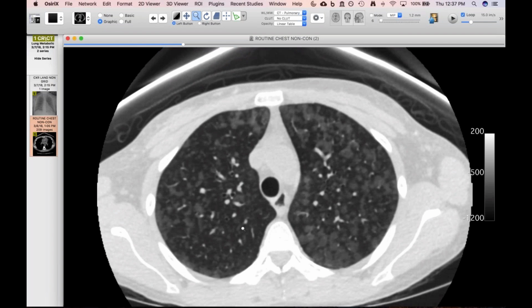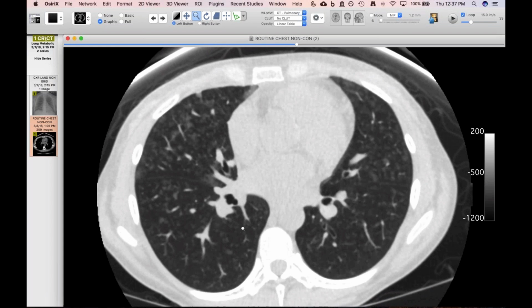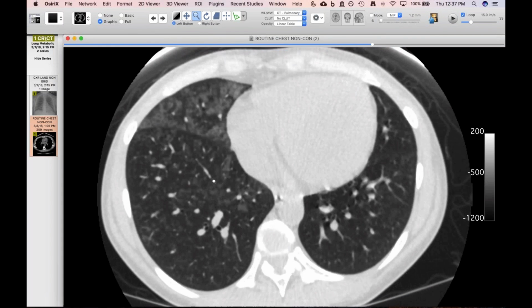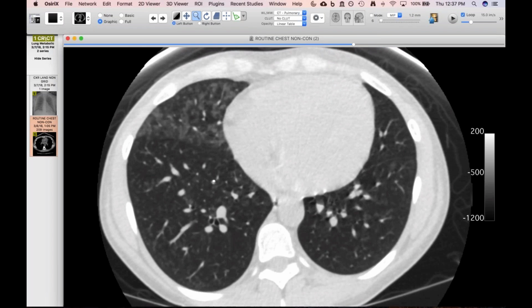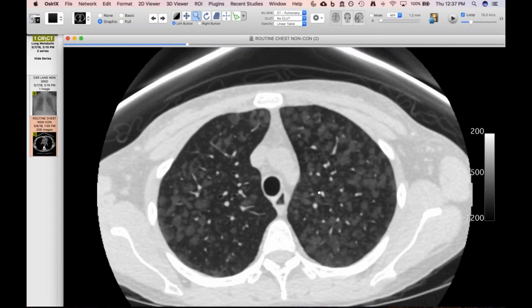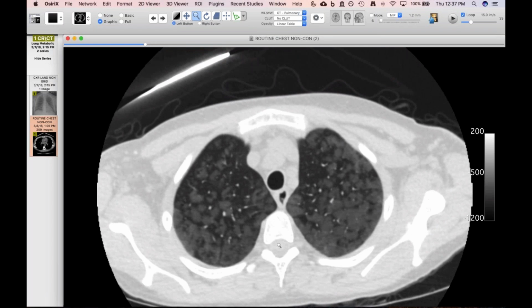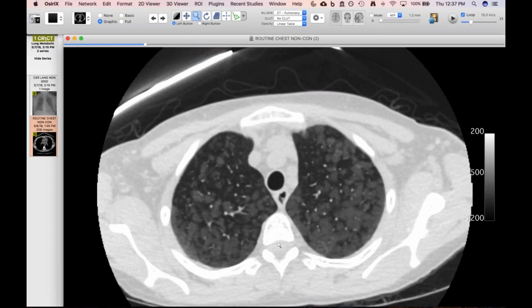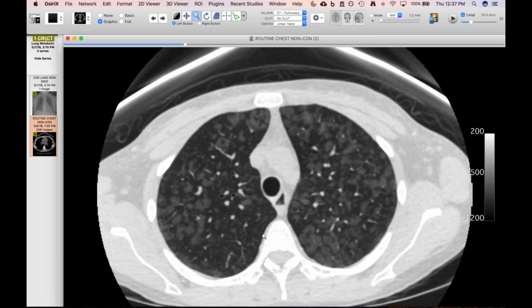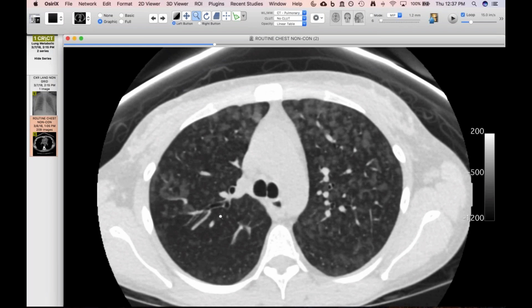And of course, she's somebody that has end-stage renal disease and she's had prior renal transplants that have failed, and she's back on hemodialysis. And she had, interestingly, at another hospital, an episode of pulmonary hemorrhage, and she was transferred here because they thought her pulmonary hemorrhage wasn't resolving. But this to me looks like metastatic pulmonary calcification, pretty classic. So then wouldn't expect this to change in this setting. And she was asymptomatic at the time that she was transferred here.